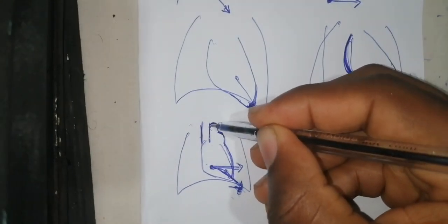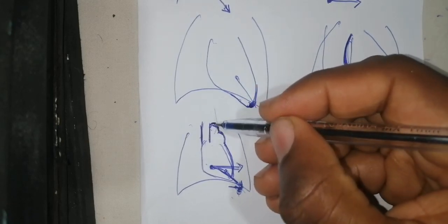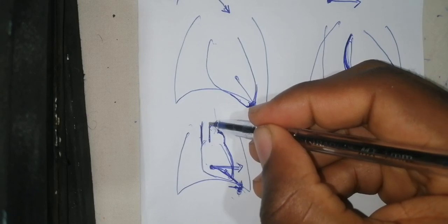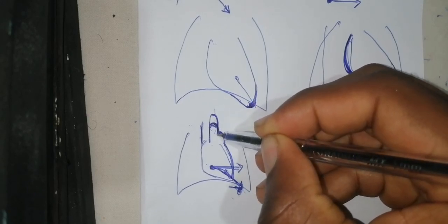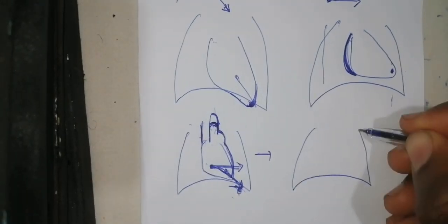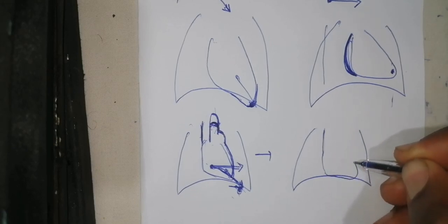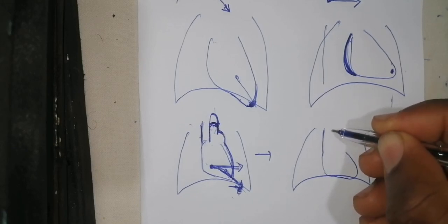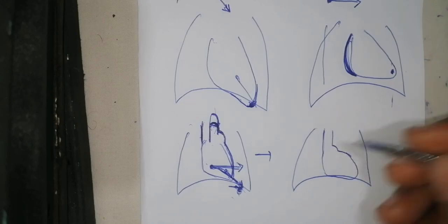When you have a problem with this arc here, let's say that there's a disappearance, there's a strengthening of this arc, is it clear? If this arc becomes more straightened, more longer, particularly in this case, let's say that you have the diagram like this. This is superior vena cava, this is the right side of the heart, this is the left side. Now it becomes like this, before you see the second and then you see the third.